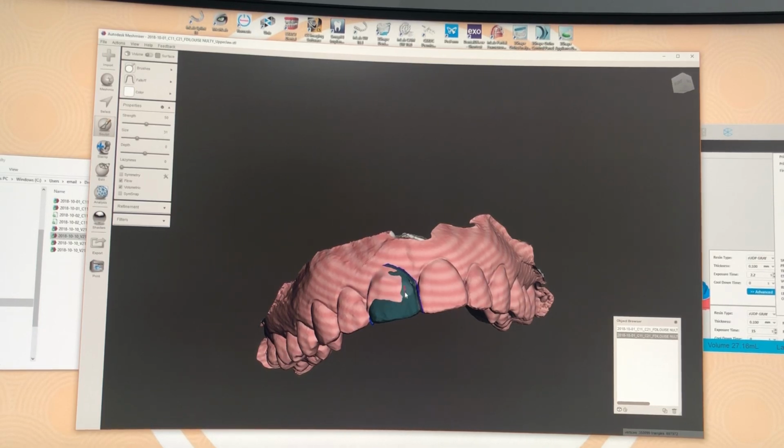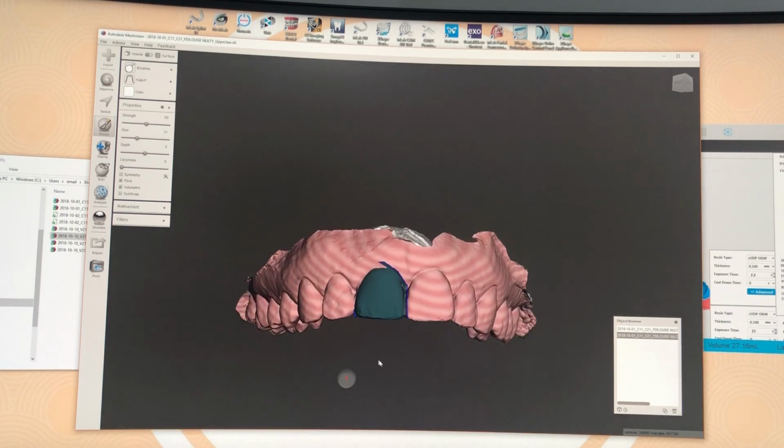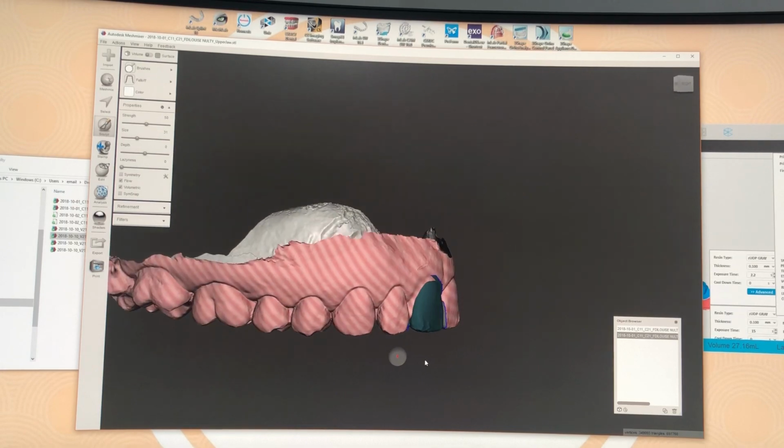And Ross, like you were saying with composite, you can use this if you have a fracture to get rid of the injury and virtually mark it up, print it off, done. So there we go. I think maybe that's okay.